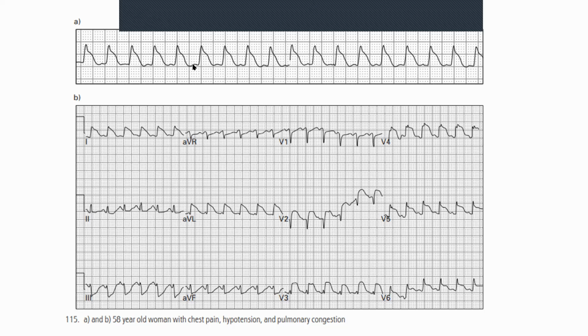So the first thing is the presence of P waves. Generally, when you've got a ventricular tachycardia, you aren't really seeing P waves at any point. So that's one thing that's already making me think, okay, it may not be. Now let's look at each zone.